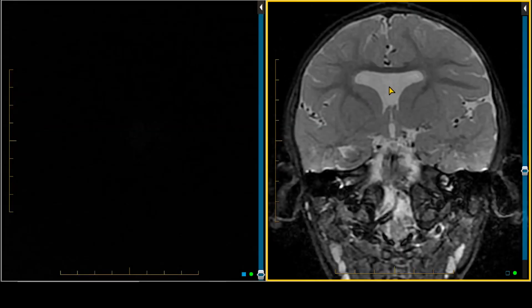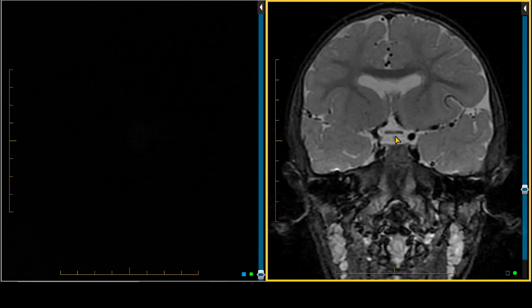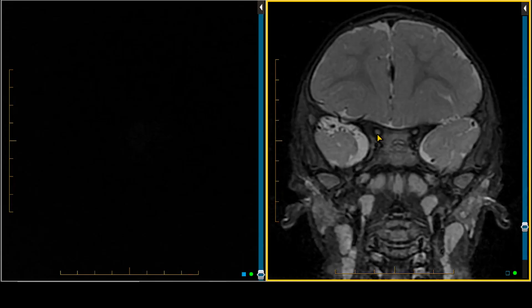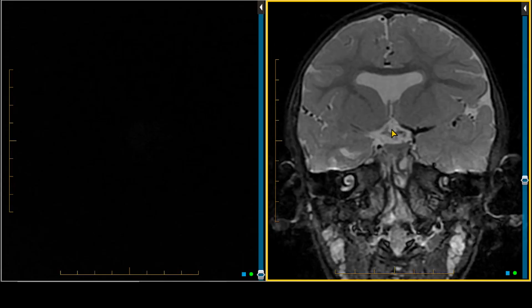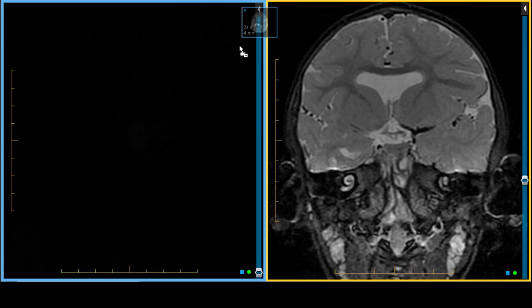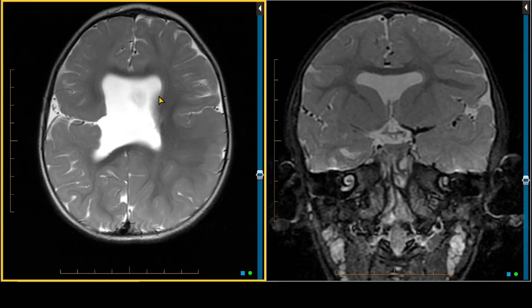This is an MRI of the brain in an 11-month-old child with small optic nerves that were identified on ophthalmologic examination. On this coronal image, we see absence of the septum pellucidum and otherwise relatively normal appearing lateral ventricles. If we go forward, we see a smaller than expected optic chiasm and smaller than expected optic nerves. So those are the features that we've described with septo-optic dysplasia: absence of the septum pellucidum and hypoplasia of the optic pathway. Now, there are additional features that you can sometimes see.